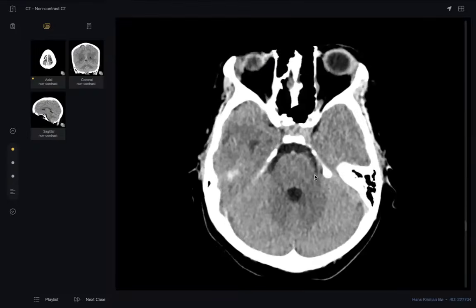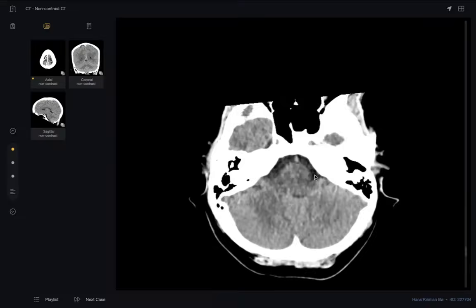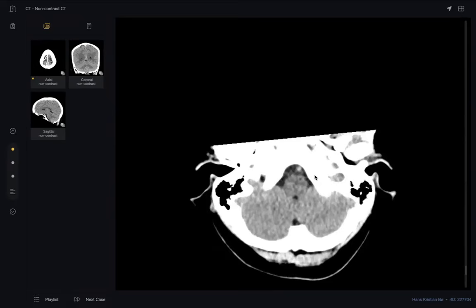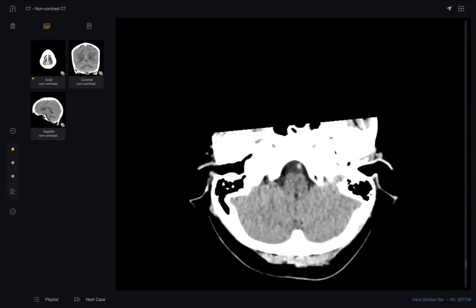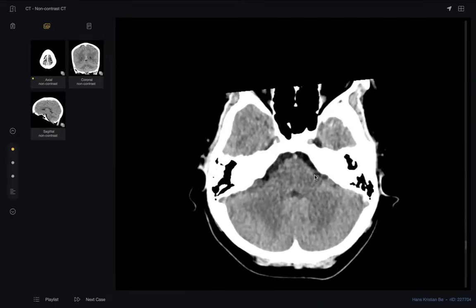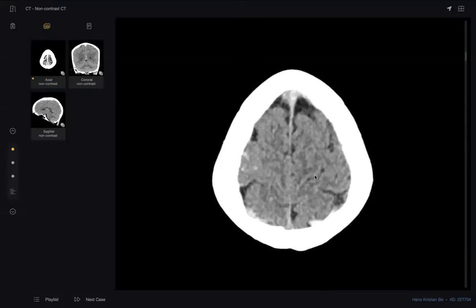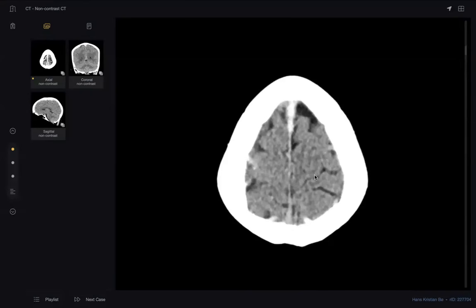Second point, while you are searching your case, you must also tell the examiner, doctor, the mastoid and both middle ears are clear, the sinuses are clear, so there is no local infection. Even there is no brain or dural collection or infection like this. So you smashed the case completely.